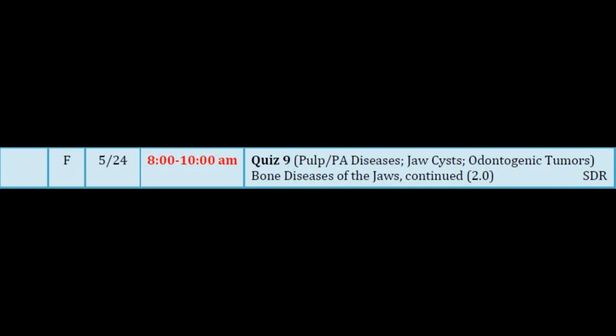So how old does she look? She looks pretty young, but she looks like an adult, maybe late teens. And she just has a little bit of bony expansion. Looks fairly gradual. Not that remarkable. It's displacing teeth. When you look at the radiograph, the first thing you should probably say is, where's the lesion?